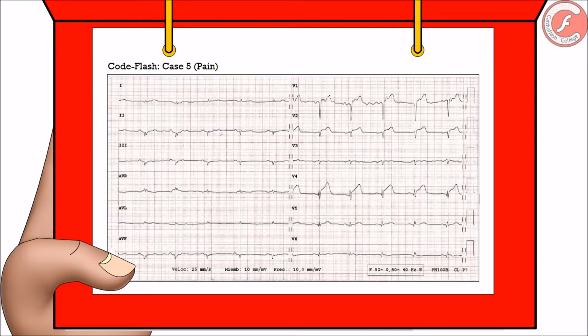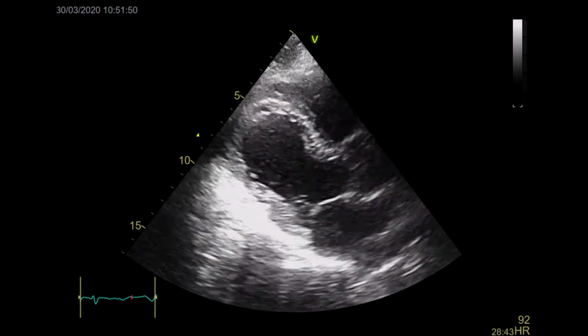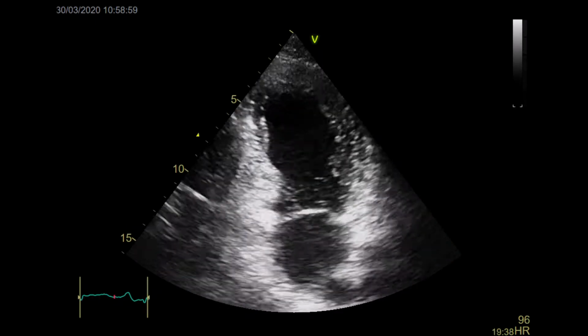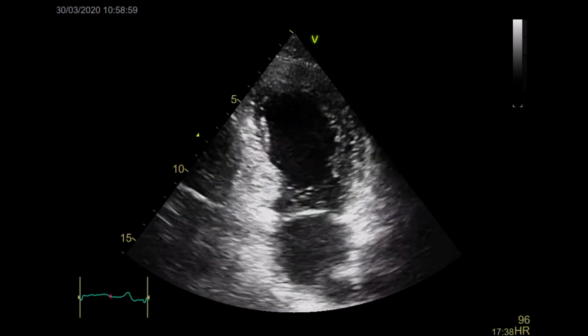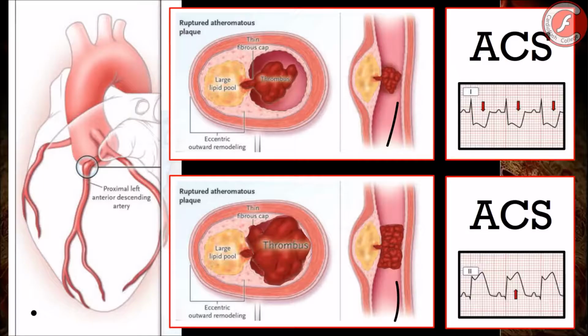However, we must not forget the microvoltage. It could be a sign of pericardial effusion, which might be related to cardiac rupture in acute myocardial infarctions. A fast transthoracic echocardiography allowed us, in this case, to discard this complication and assign the microvoltage to another cause, the COPD. But what clinical relevance does this have?